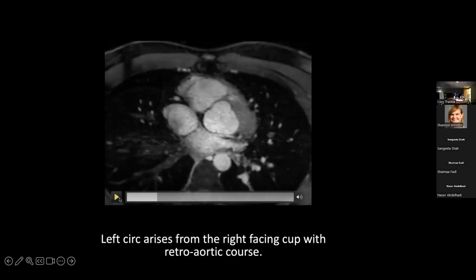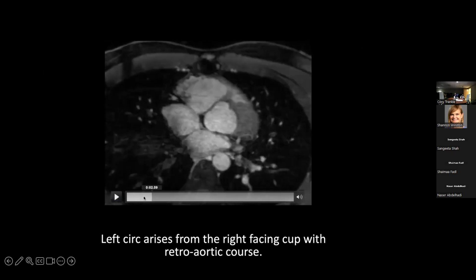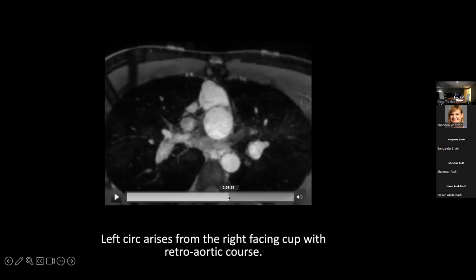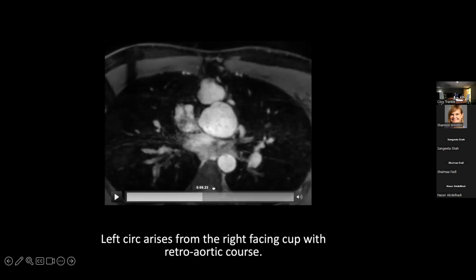This is a coronary gated sequence of MRA, and it shows the coronary arteries. I'm scrolling slowly through that, and we can start from the left. The left is arising from the anterior facing cusp and reaches its territory to the LAD.